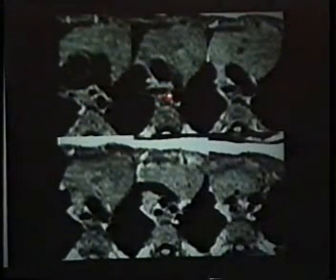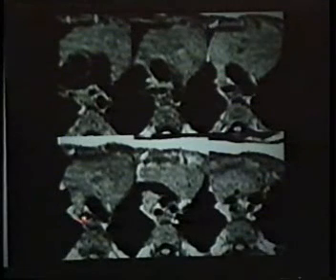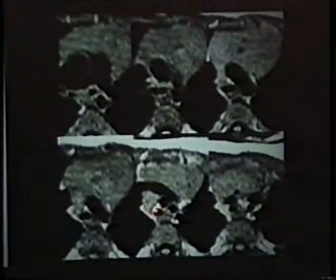Let's look in the axial plane. Level of the pulmonary artery, right bronchus, left bronchus. At the carina, moving up, ascending aorta, descending aorta, under surface of the aortic arch, tracheobronchial tree just above the carina, top surface of the aortic arch, trachea. Your 3 great vessels, your left subclavian, your left carotid, your right innominate, the innominate vein passing over the superior vena cava. The tracheobronchial tree is widely patent. But look at this image right here. The trachea is nearly completely obliterated as the right innominate passes anteriorly. This made me a believer. It corresponded beautifully with the findings of bronchoscopy.